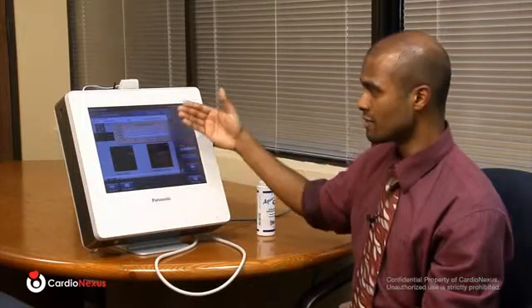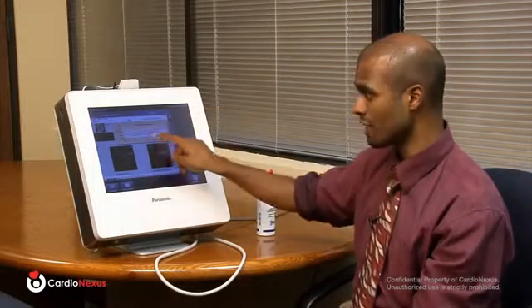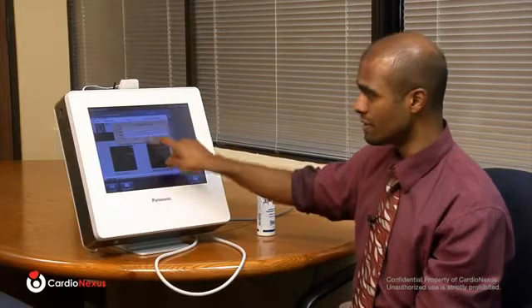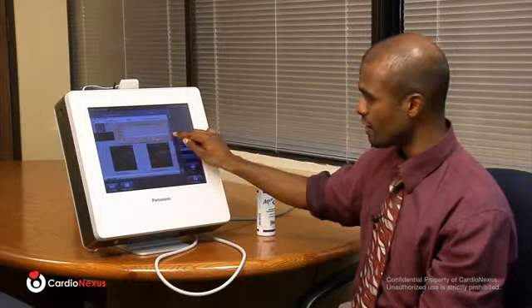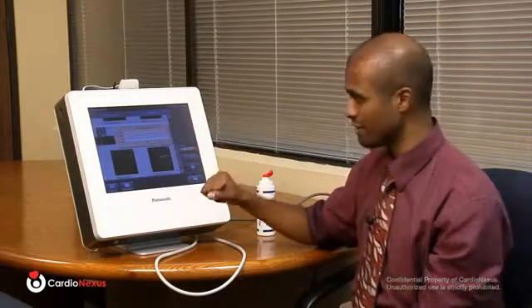And this references, in this case, the ERIC data table, which was used to give that IMT percentile. So again, if you were to have a carotid artery wall thickness of 0.47, he'd be considered in the less than 25th percentile for his age. Just below that, you have the same summary, but for the left side of the patient.